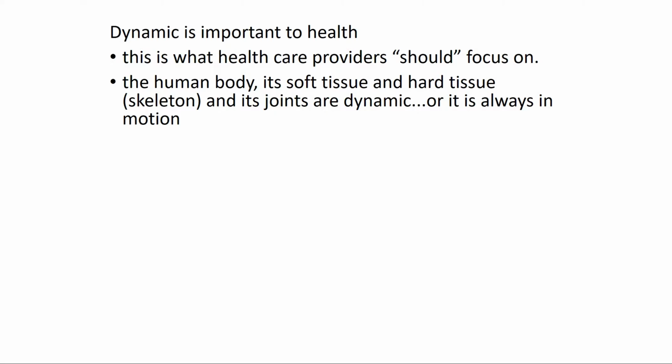Here we're going to look at some x-rays and some other factors, because I want to show you the significance of dynamic versus static, and how having a dynamic body and having things stay in motion is really good for structure and function. And as a sports medicine practitioner and functional medicine practitioner, I of course think, as a bias, that providers should focus on the dynamic importance of health.